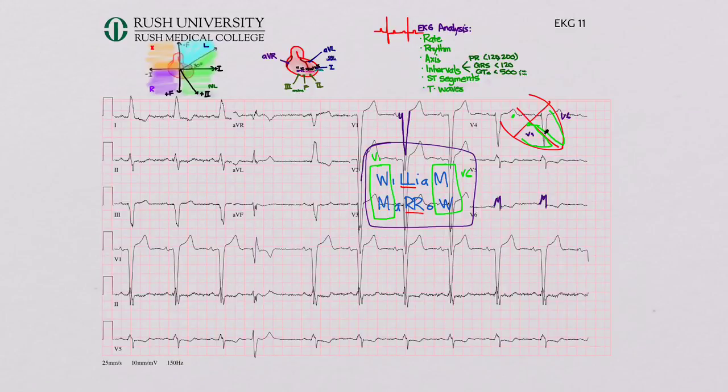It's a nice narrow QRS. And now you have one that shows a left bundle. Worry about an MI, a myocardial infarction. Okay? And so that patient would need to go to the cath lab. In this case, I would probably talk it over with the cardiologist or your ED attending and decide whether you want to call this a myocardial infarction or not.